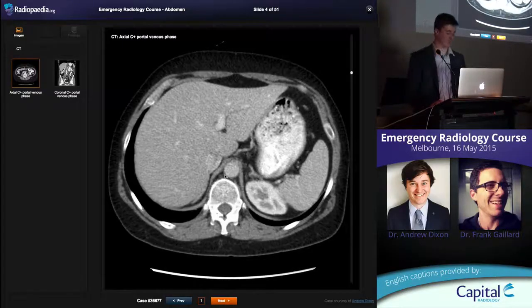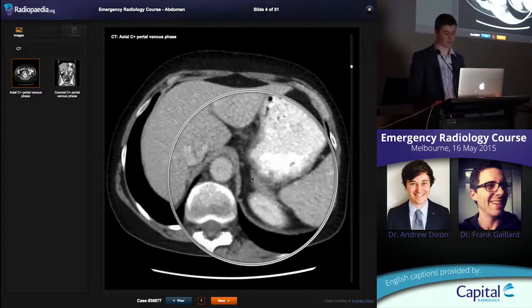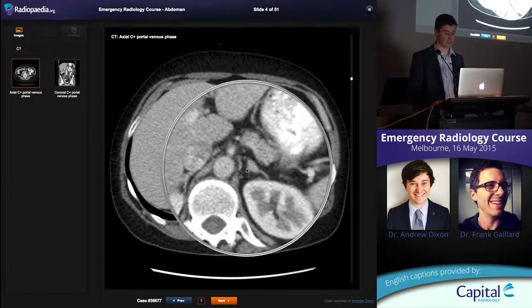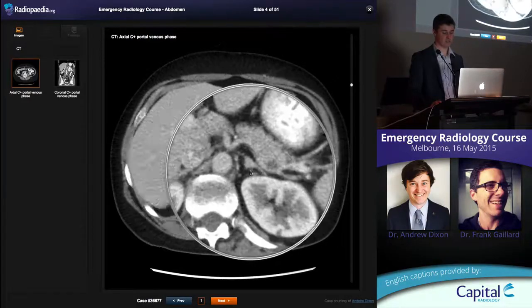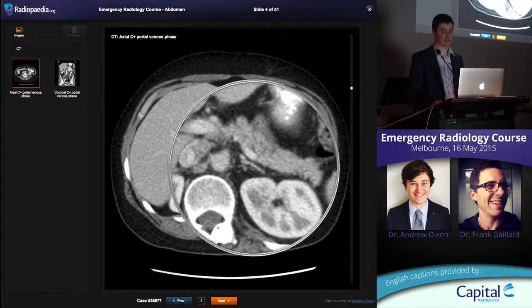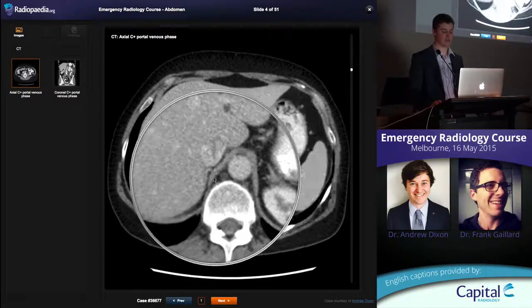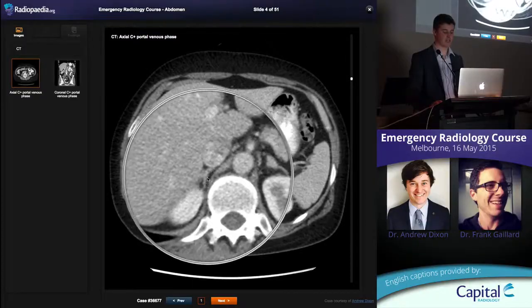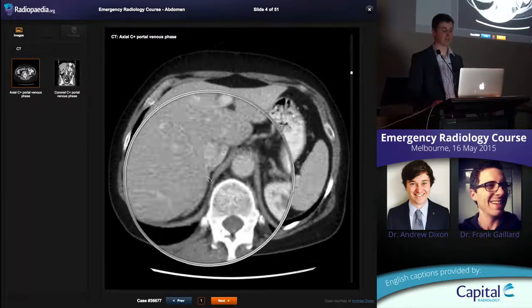Adrenal glands are something that people really, really struggle with, and I think it's because Netter drew them as being these nice little blobs sitting up on top of the kidney. So this is the adrenal gland here. See that little thing sitting out in front of the kidney? So that little linear thing there, it's got a medial and a lateral limb to it. Okay, it's a little bit pyramidal in shape. On the other side, it's this tiny thing here. See that? That little thing. So that's the adrenal glands.